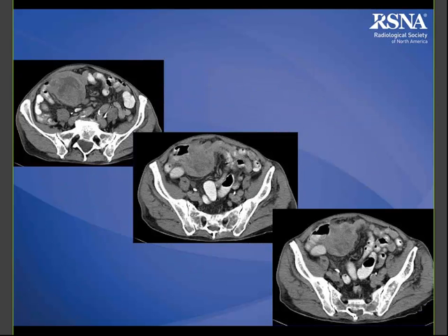So here's an example. You might think, oh, she was talking about lymphoma, and this looks like lymphoma. And it very well could be, but this ended up being gastrointestinal stromal tumor. But what we do see is some areas of heterogeneous enhancement in this large exophytic mass. It's not causing any bowel obstruction, but it is cavitating to a certain degree, and this was a GIST. But if you thought lymphoma, you definitely would be correct in your differential.